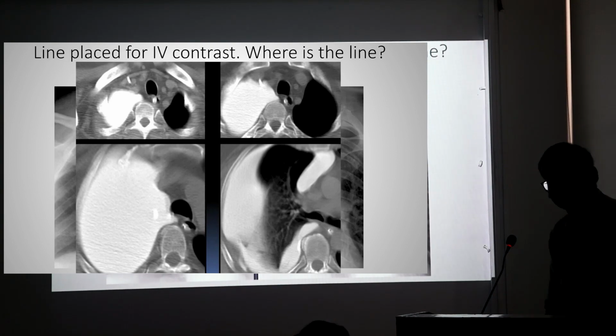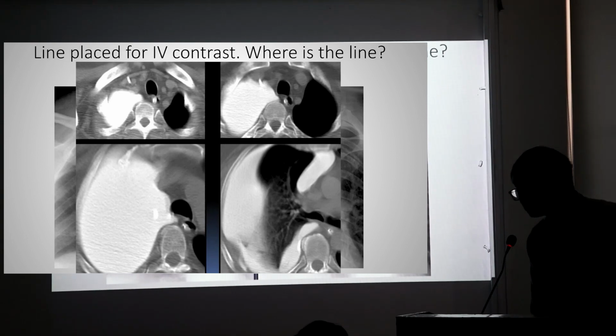The first picture looks like it was there too much inside. Yeah, then it was withdrawn. Okay, so does it still look like it's in the normal position? But then look at the tip on the X-ray. It's looking like it's directed outward, isn't it? That doesn't really happen like that. But still, nobody was sure. Nobody can actually comment further on where exactly it is.